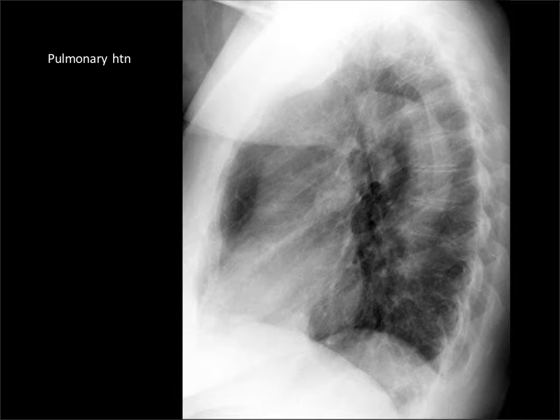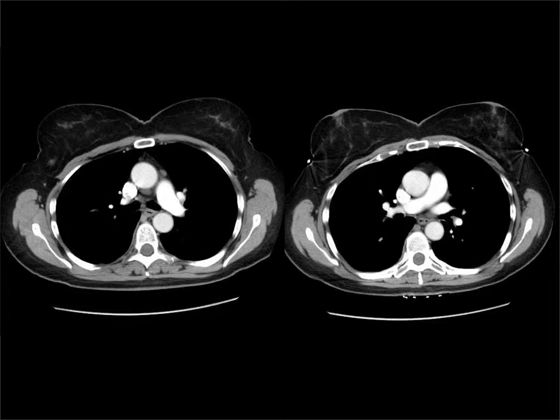So just to show you again without the lines on it, the left is going backwards, it's your mini aortic arch, and the right is anterior and makes a circle. So here they are on a CT. CT cut A is slightly more cranial to CT cut B. Here is the left pulmonary artery sweeping backwards. Here is the right pulmonary artery kind of coming out to the side. So if you imagine on a lateral chest x-ray, this one's going to look like a circle, and this one's going to look like a tube.